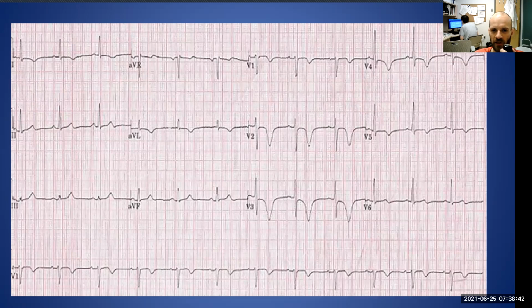This ECG hasn't projected quite so well, but here the main abnormalities are that once again we've got a sinus rhythm. This time we're going at a normal rate with 1, 2, 3, 4 big squares between QRS complexes, so our ventricular rate is about 75 per minute-ish.